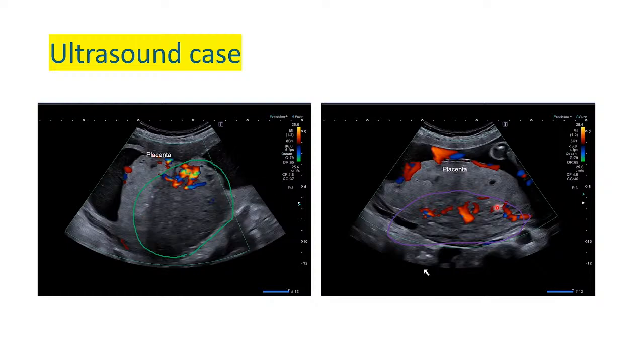So you must be aware of this when you're doing an ultrasound scan. Don't report them as masses or other lesions. That is one of the pitfalls when you're doing obstetric ultrasound, especially in the third trimester. When the Braxton Hicks contractions also happen in the lower segment, you can think that it's cervical funneling, and then you think that the cervix is opening. Yet it is the Braxton Hicks contractions.